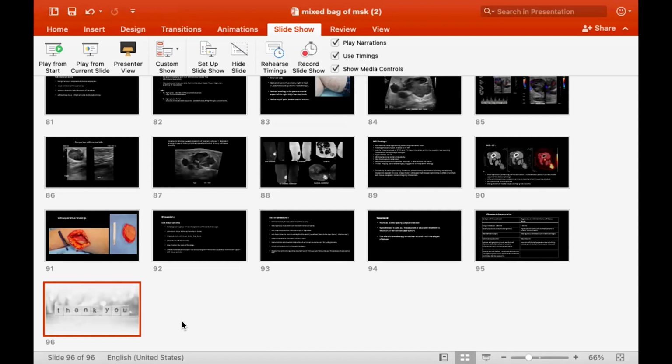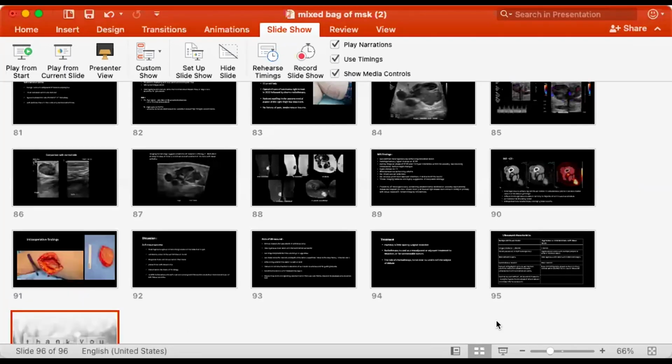We try a lot for the lateral meniscus, ma'am, but we cannot evaluate it properly on ultrasound. That is my experience. Posterolateral is one of the easiest. Anterior and mid body are very difficult. But the posterior components, posterolateral and medial posterior, we can see very nicely because there is no overlap of the bones.